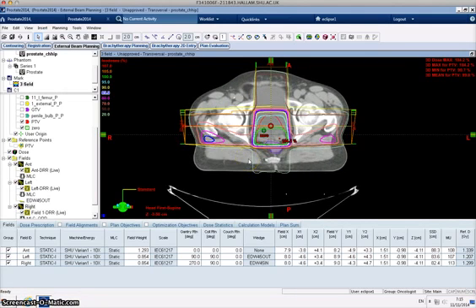What we can see now though is we've got these hot regions underneath the wedge, which is quite common. So we're now back to having more than 80%, and we can see we've now got a dose gradient in this direction. So it's not as bad as it was before, but we've got all the 100 plus, so 104 posterior and less anterior, and so the combination of that and that tells me that the wedge that we've put on is too big. So what I would go back and do now is reduce the wedge and then recalculate once again.